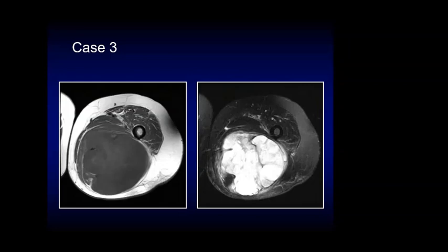So which compartment is this? Posterior. Left. Upper limb or lower limb? Upper limb. Lower limb. Okay, which part of the lower limb? Upper thigh. Okay, so it's in the thigh. The compartment, we talked about the compartments in the thigh, so I'm going to give you three. Sorry? Maybe posterior and medial involved.